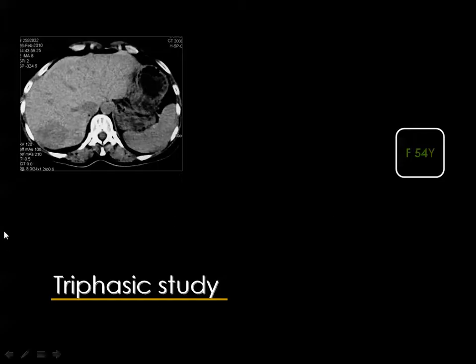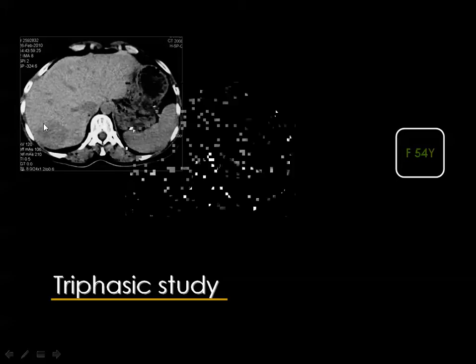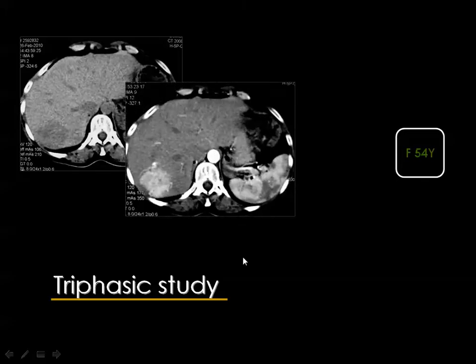And this is an example where you can see this is the pre-contrast scan, which is obtained routinely before any examination of the liver, where you can see a focal lesion here. Then look at the arterial phase, where the contrast media is maximally concentrated in the aorta, and you can see enhancement of the focal lesion as well.